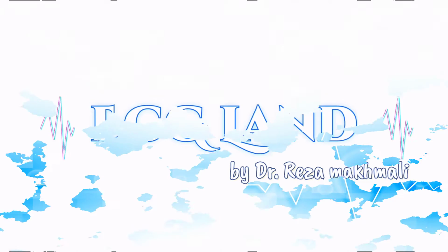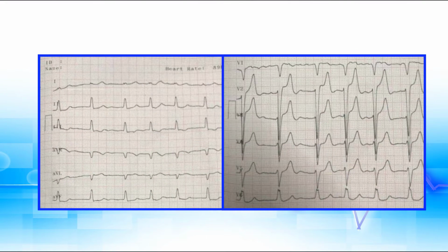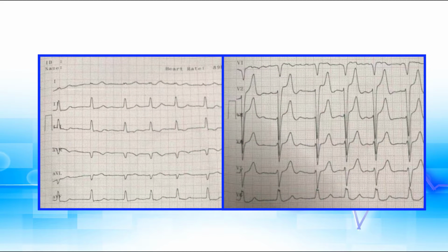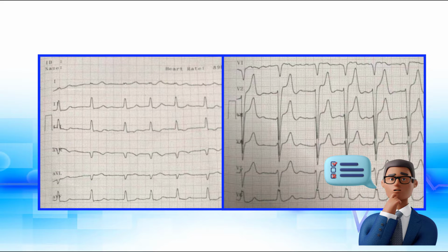Hi everyone. The present electrocardiogram belongs to a 90-year-old female, known case of hypertension and rheumatoid arthritis, presented to emergency department with generalized weakness. What do you think about the surface EKG? Which one is the correct interpretation?